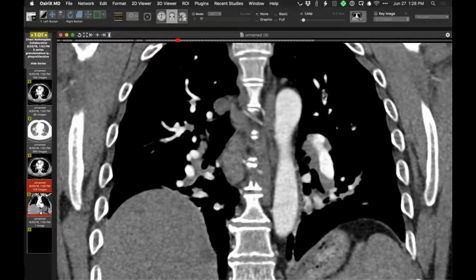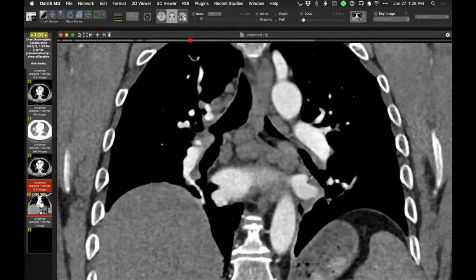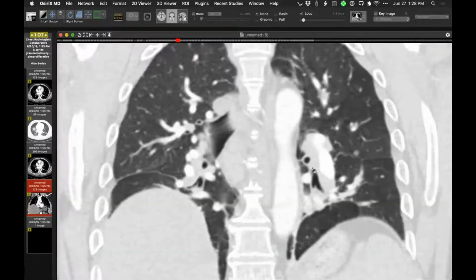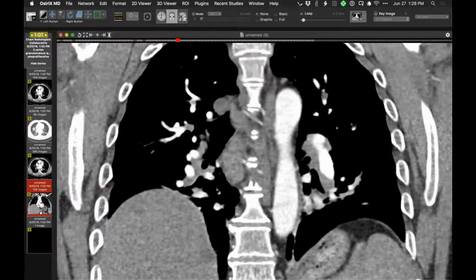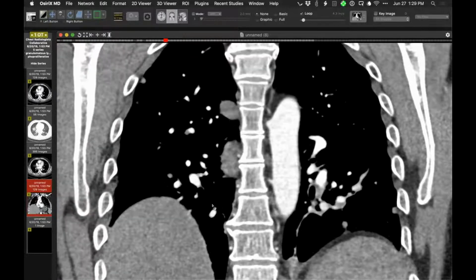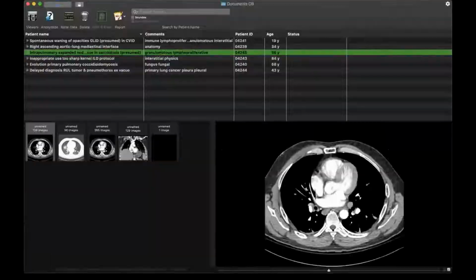Look here, for example, right between the vessels, and there. They definitely are not in the vessels, but just adjacent to it. There's a lung window. Doesn't help that much. I see that occasionally, and I think I see it in sarcoidosis when I do see it. Right there. All right, those are my cases.